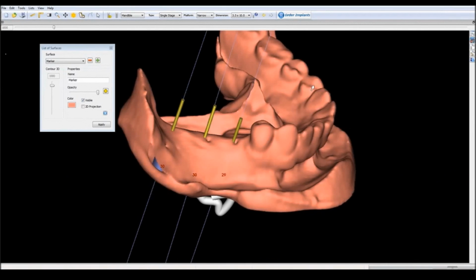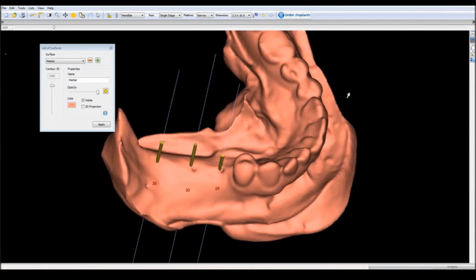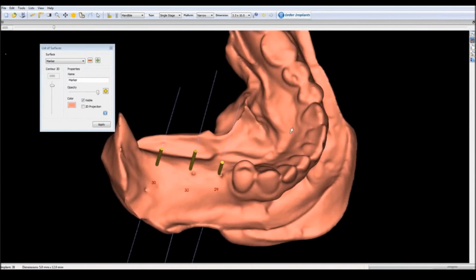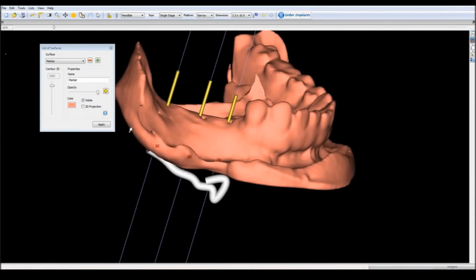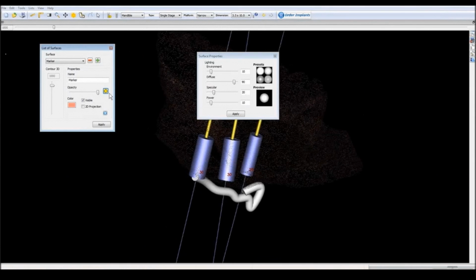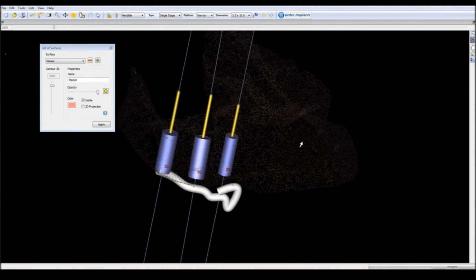Sometimes virtually, if you have a large rounded arch, you can place the implant beautifully, but you might find the implant to be off-center clinically when you look at it in this fashion. So I like these divots as a frame of reference. And if, in fact, I'm way off, I can go back to see why I'm way off, and then I can see about correcting it.